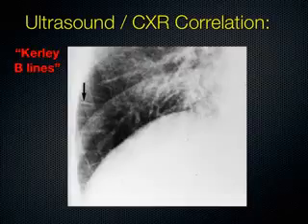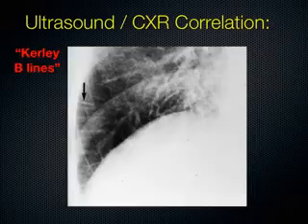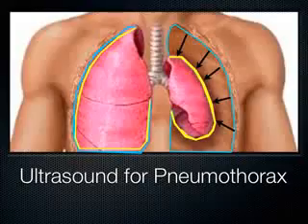Okay. We're going to move on. We'll have some time at the end for more questions about A and B lines, but we're going to move on to ultrasound of pneumothorax. And just a reminder about what a pneumothorax is.